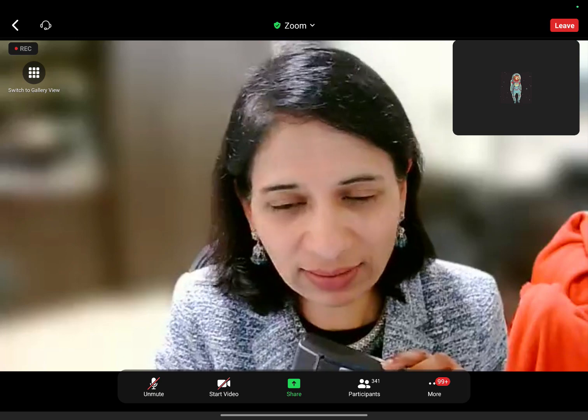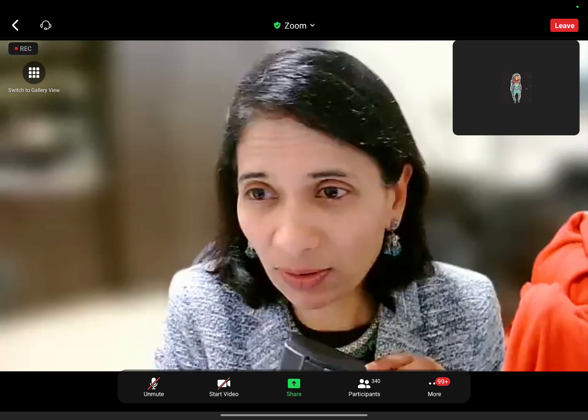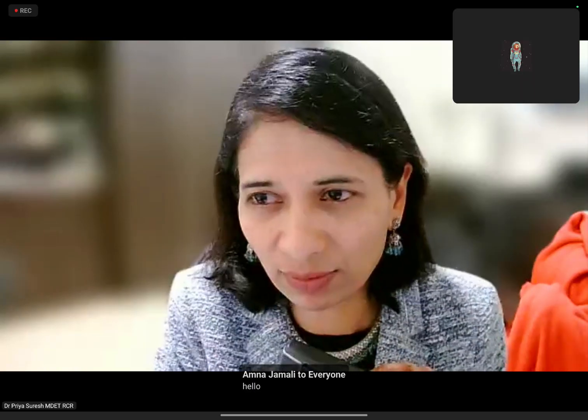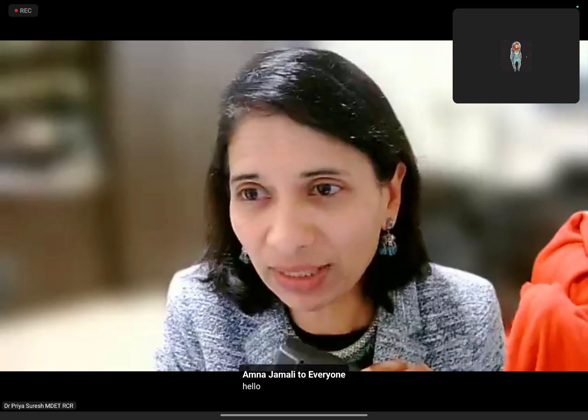And what I say is an elephant is an elephant whether on land or sea. So if there are cortical based lesions and you are thinking about non-ossifying fibroma, it doesn't matter if they are multiple. But the main thing is the description, the soap bubble appearance. If you look, you can draw with a pencil, isn't it? It's a very narrow zone of transition. Would you agree with that?